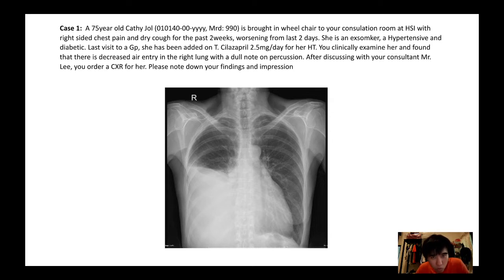So today we're gonna do chest x-ray interpretation. So this looks like a PA x-ray, although there should be a label telling us that. Because we want to identify whether this x-ray belongs to the patient and look at the date and time of the x-ray. And then you want to look at the quality. Quality, there's a mnemonic RIP. R stands for rotation. Doesn't look rotated.